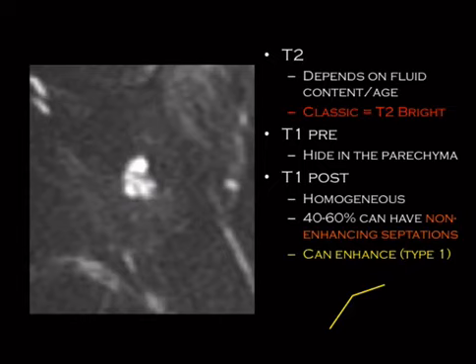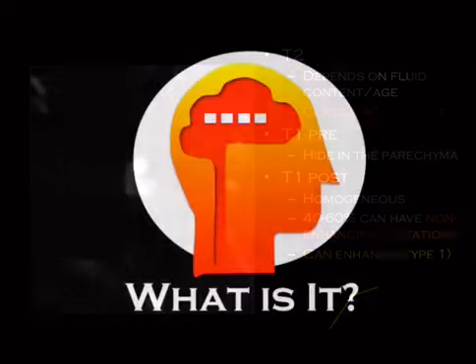That's the rapid washout. That's the bad one. Stock market falling is bad. Good things have a progressive enhancement curve. And since a fibroadenoma is a benign entity, that is the enhancement pattern you can expect. They do not have to enhance, and when they don't, that makes it even more confident that it's a benign entity.